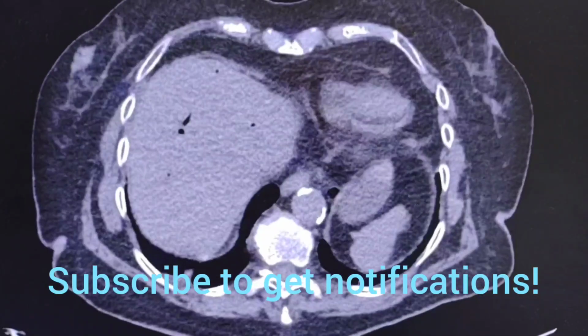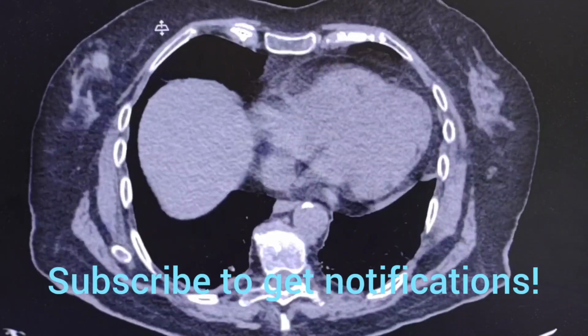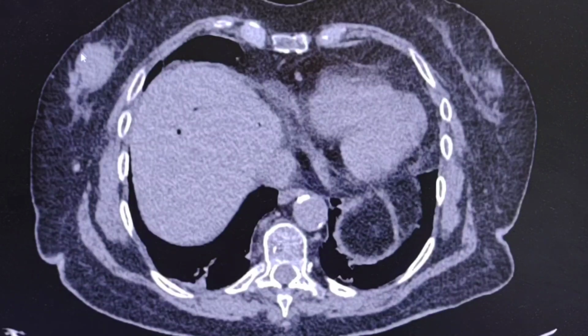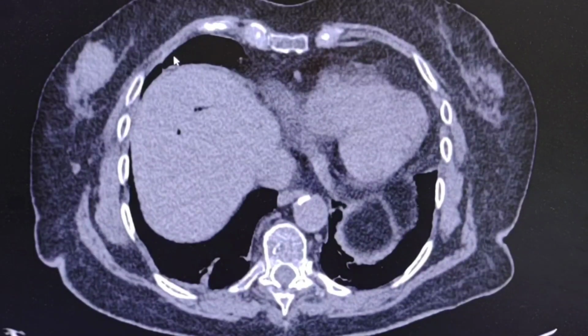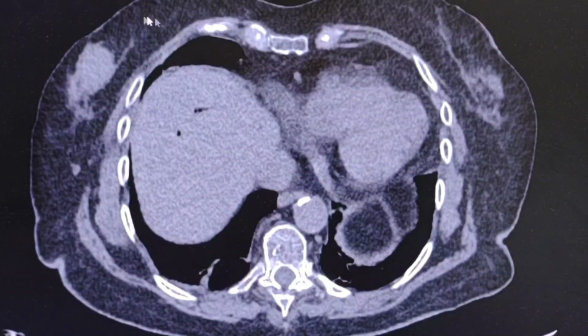By the way, as an incidental finding, there is this lesion in the right breast. It shows irregular contour, so we have to report it. We have to mention it in the report for further evaluation.